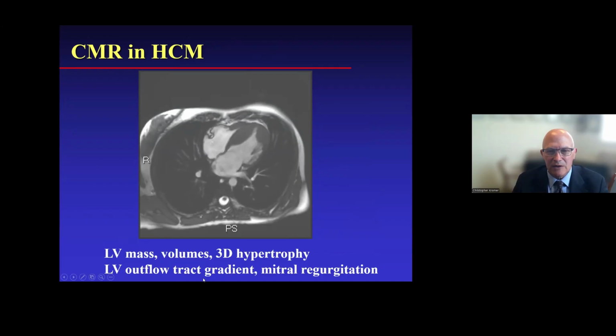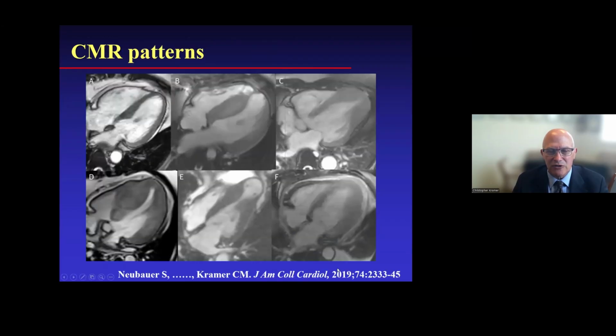These are 6 different morphologies that we described in our HCMR baseline paper, which was published in JACC back in 2019. About 45% or so were like patient A, isolated basal septal hypertrophy. Another 40% were like patient B, with reverse septal curvature morphology with the thickest portion in the mid septum as opposed to the basal septum.